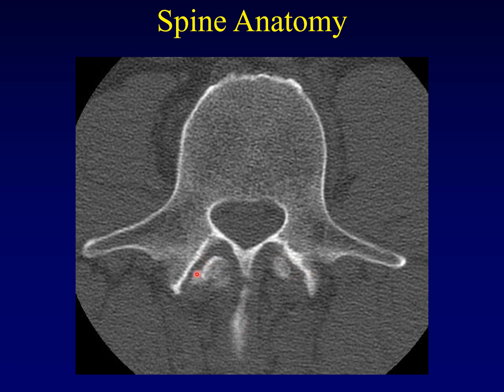And here you can see the joints between this vertebral body and the one above. These are the facet joints. Again, I'll emphasize how in the spinal canal, without the use of contrast, hard to tell things apart.